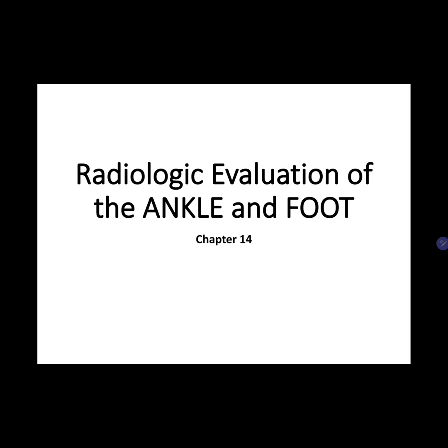Welcome to chapter 14. We're going to talk about the radiologic evaluation of the ankle and foot. So, injuries to the ankle and foot occur with great frequency, and the ankle is considered the most commonly injured major weight-bearing joint in the body.